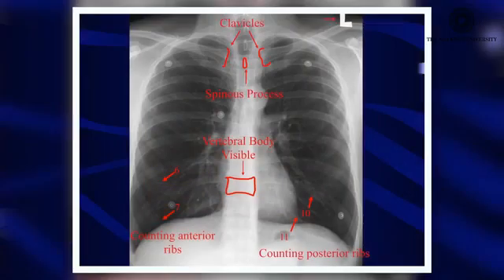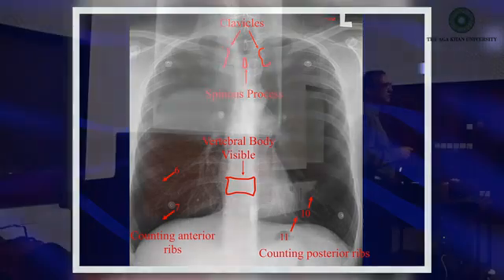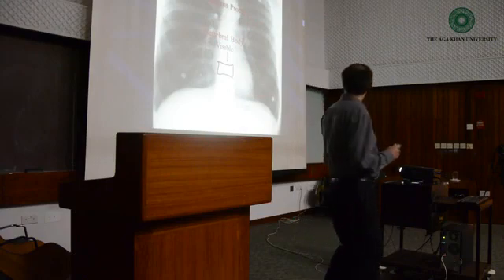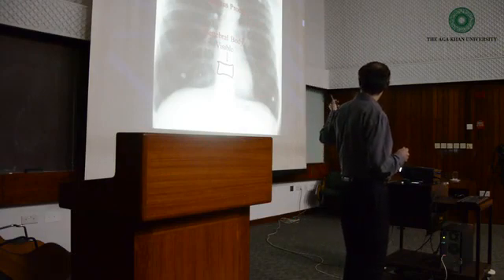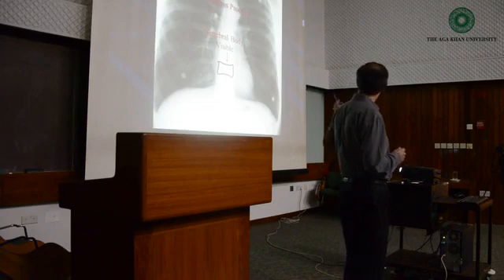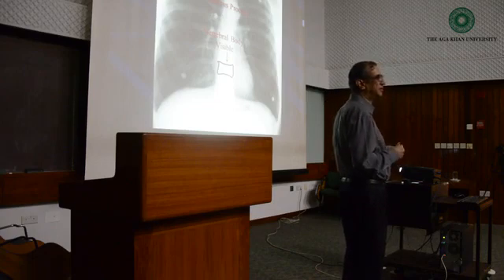Can everyone see the, okay, let me first shade it. Okay, can you see the vertebral bodies? This one has been shaded red, but the one below, can you see it? Isn't it just visible, not very easily seen? It's not invisible, it is visible, so that tells us about exposure. If it is just visible, it is an adequate exposure.